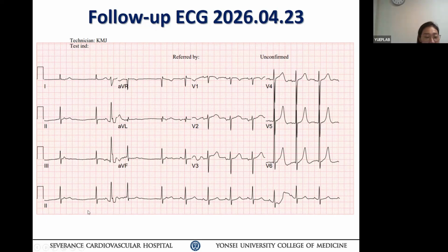The pattern is similar here. This could be the junctional beat, and this could be the sinus beat. And maybe this could be sinus or PAC. This is the junctional beat because I cannot see the P wave, and I suspect this could be a PAC, but it seems not conducted. After that, the P wave seems regular, with a rate of about 75 to 80.